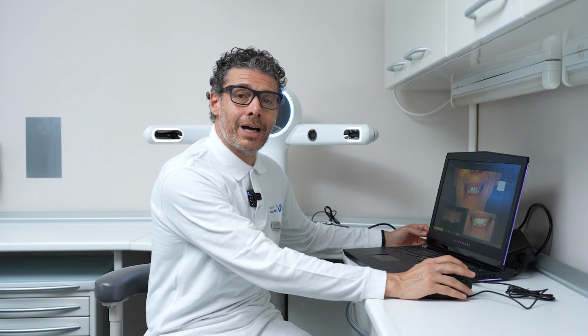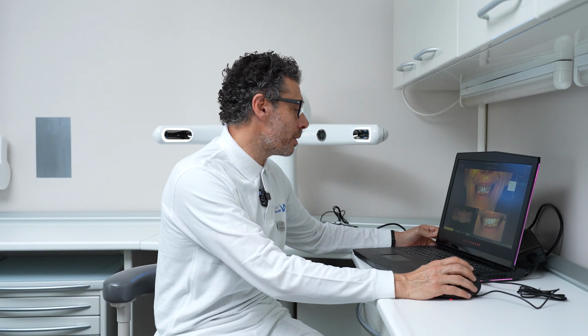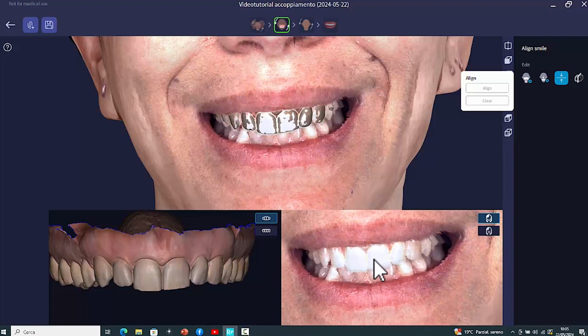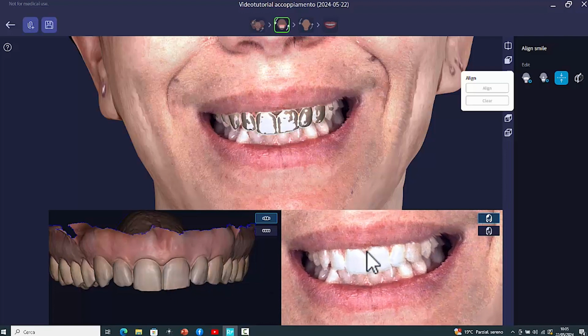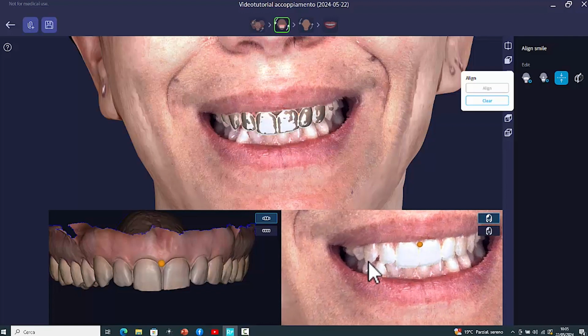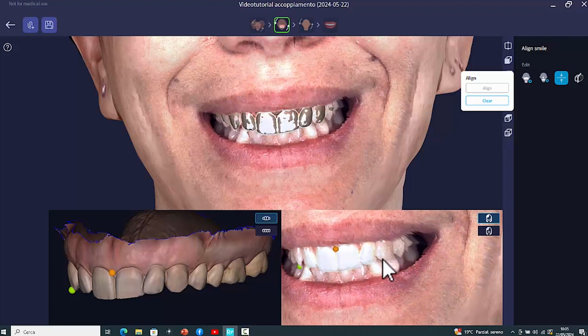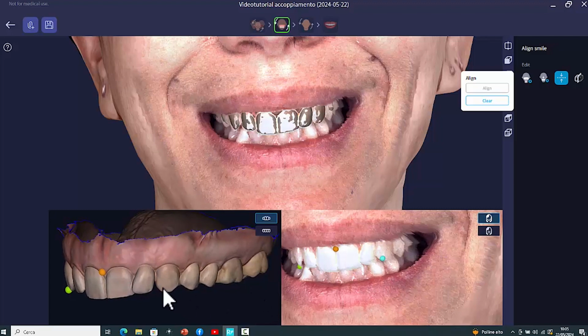We now proceed to manual alignment with the 3-point technique. I check the upper intraoral scan and I start to choose the 3 points. Usually we choose an anterior one. In this case, the area of the interproximal papilla of the 2 central incisors, which is very well visible, and then we go more posterior to the cusp of the right canine, clearly visible here, and the other contralateral left canine cusp.